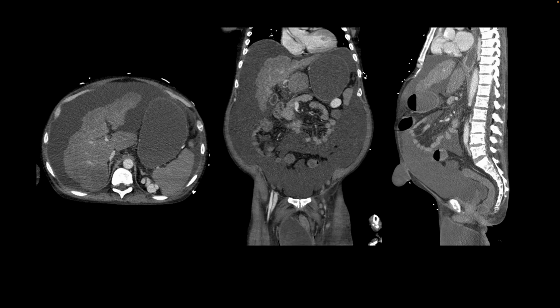This is our next patient. They presented with abdominal distension. We performed a CT of the abdomen and pelvis. On this axial image, we see cirrhotic liver, large volume ascites, some portosystemic collaterals, and then a large fluid-containing right-sided hydrocele, a communicating hydrocele, and then the fluid has also gone through an umbilical hernia and it's protruding outside the abdomen, seen right here. So multiple findings all related to cirrhosis and ascites.